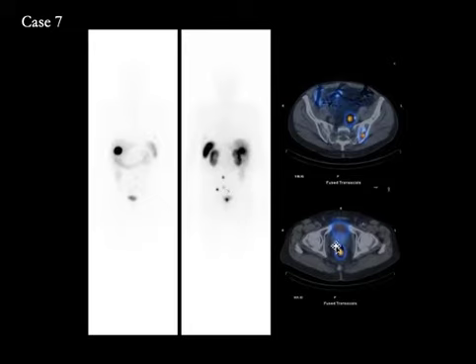The colonoscopy found the focus was not in the sigmoid colon but in the rectum, and here is that focus localized in the rectum as a focus of increased uptake. There is evidence of bone metastases, there is evidence of presacral nodal metastases, and as we saw earlier, there is liver metastases. So this is a patient with history of rectal carcinoid with bone, liver, and soft tissue metastases.